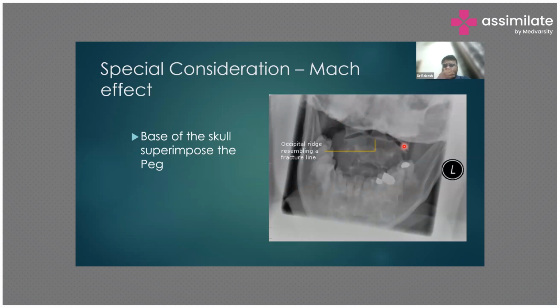Now, because peg fractures are very common at the base of the odontoid peg, you may confuse this as a fracture, but this is usually a Mach effect. It's just an adjustment in the position of the patient will eliminate this effect.